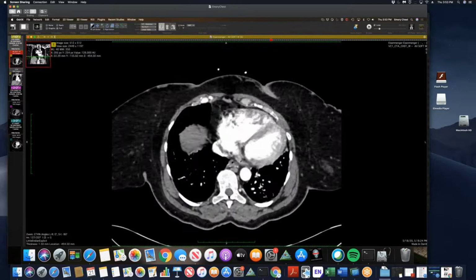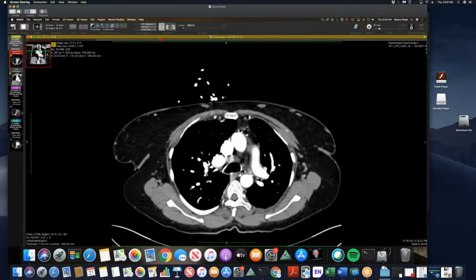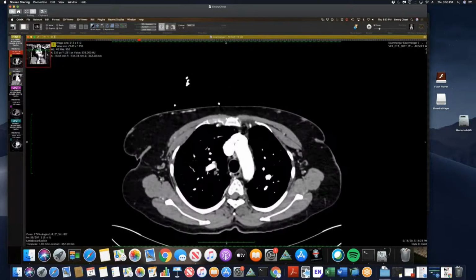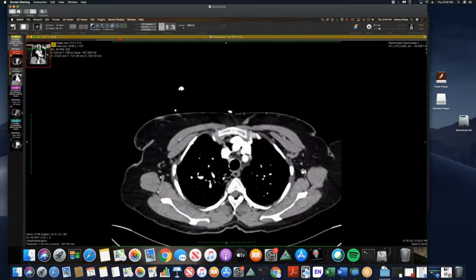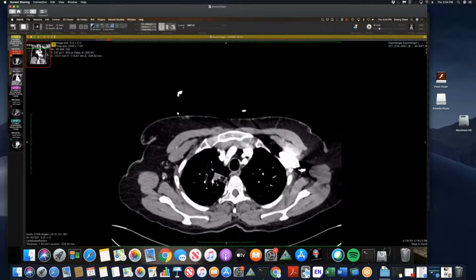She also has a lot of bronchial artery collateralization here. This was actually done for hemoptysis, and I'm presuming that these opacities up here, which were new compared to the prior, are hemoptysis, and you can see the large vessels coming in there, probably bronchial artery collateralization.